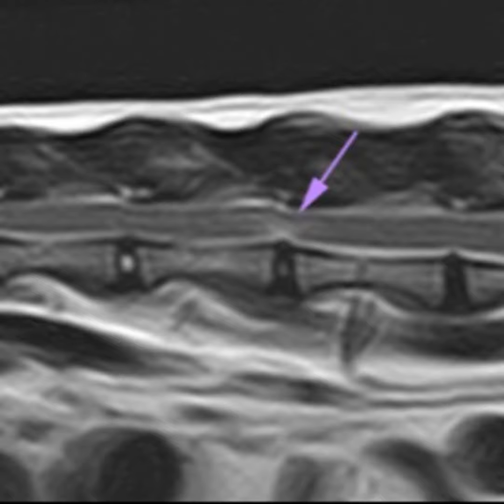So in the discussion, we discussed the results grouped by the aims of the study. The first aim of the study was to analyze the prevalence of disc herniation. Few studies have investigated the prevalence of this condition in cats, reporting a rate from 0.12% to 0.26%. So the prevalence in the overall population of cats at our institution is 0.23%, and agrees with previous studies, reflecting the low predisposition of cats to intervertebral disc herniation.